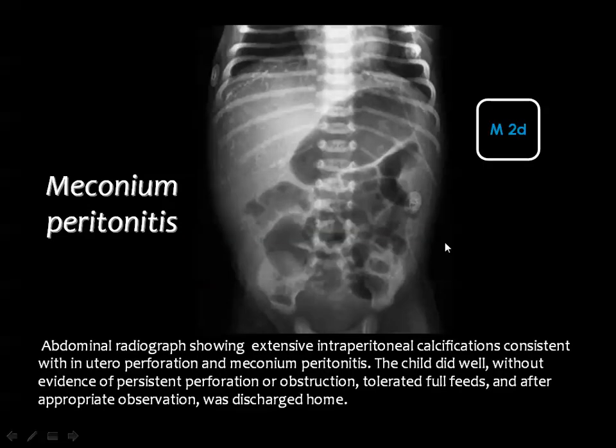And whenever you see calcium within the peritoneum in a neonate who is 2 days old, this means that there is some sort of perforation with meconium in the peritoneal cavity, leading to such calcification. It's important to know, and I would like you to look at this.